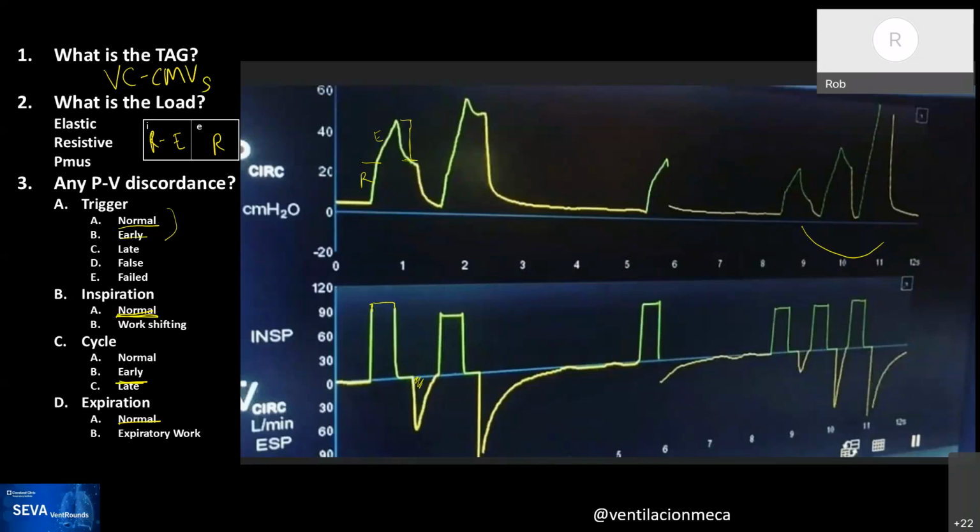But from a micro point of view, the ventilator, very sophisticated ventilators anyways, they look at the tidal volume that's exhaled every breath, and they make micro adjustments to the flow, the peak flow, so that you get the tidal volume that you have set. So behind the scenes, it's always some form of adaptive targeting for these very sophisticated ventilators. And I think that's why you see these small changes in the peak flow, even though the flow was preset and so was the tidal volume. There's a paper written on that by Sanborn.